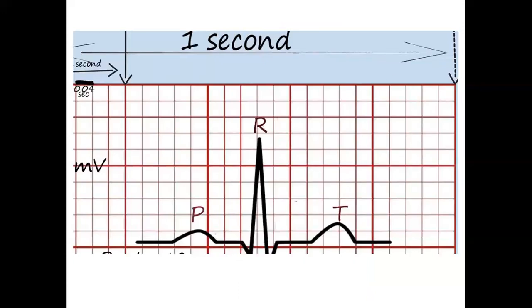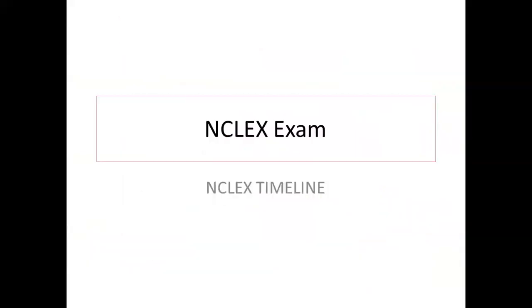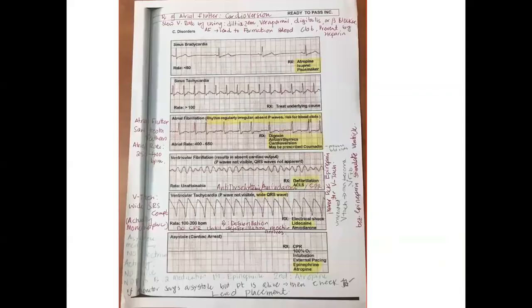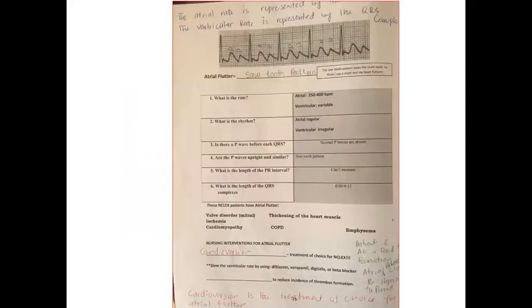So this is a graph of voltage versus time of the electrical activities of the heart, when we use electrodes placed over the skin area. Like in this picture, we can see we put the electrode over the heart, and this electrode can represent it, looking like this. We call it a graphical representation of cardiac events, right?